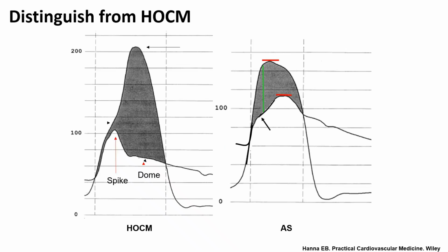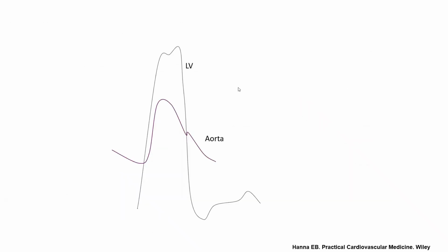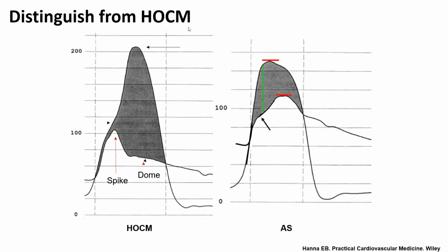Okay. And I'm going to highlight another important differential diagnosis of a high LV aortic pressure. So this is one differential diagnosis, which is false measurement, error in zeroing. Second and most important differential diagnosis of an LV aortic pressure gradient is what we call HOCM, dynamic LVOT obstruction. And here the morphology is what helps make the differential. So notice the aortic stenosis morphology here on the right side, and notice the HOCM morphology on the left side.